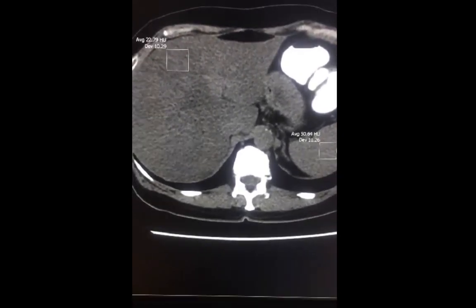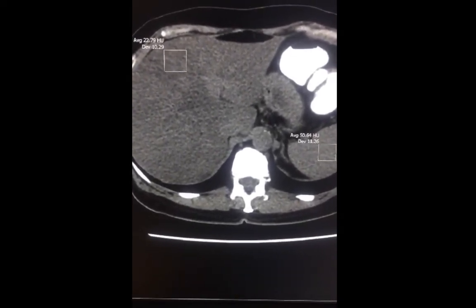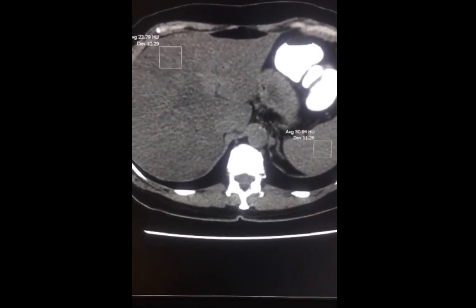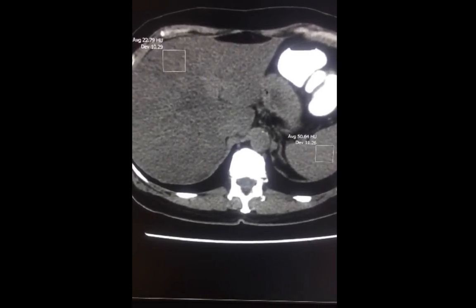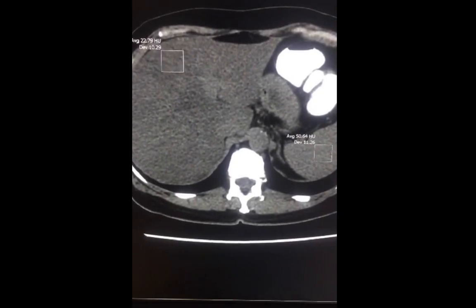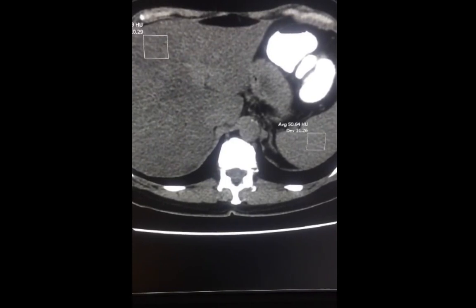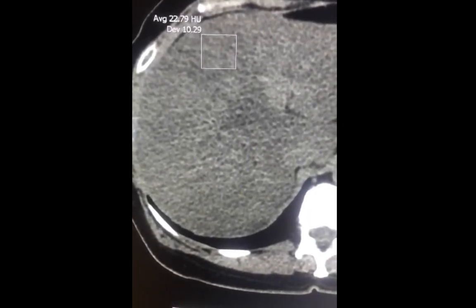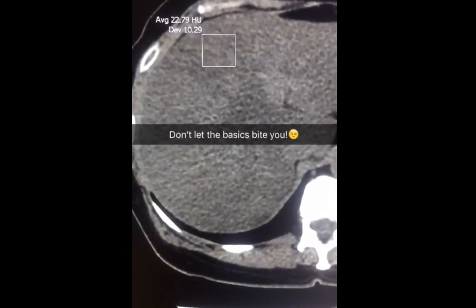Steatosis is the commonest. Visualizing a lower attenuation of the liver and clear distinction of the hepatic intraparenchymal vessels are signs of steatosis. More objectively, on unenhanced CT scan, the density of the liver should not be lower than 10 compared to that of the spleen. Remember that this rule of comparing the liver to the spleen is performed on unenhanced CT scan. Finally, you could use an absolute measurement of less than 40 to diagnose hepatic steatosis, whether it's with contrast or without contrast. This was a good case for juniors, but also seniors.